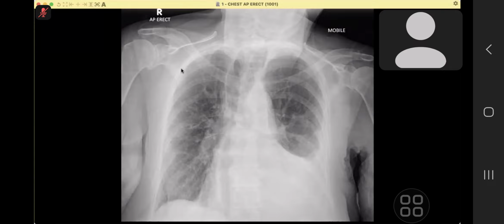I'm checking the lung for evidence of any nodules. There are some tiny nodules bilaterally in the lungs, but I would prefer to zoom in to check them more properly. So to summarize, there is a mediastinal widening with an air-containing structure, likely esophageal dilatation. So I would take the case further with a barium swallow.